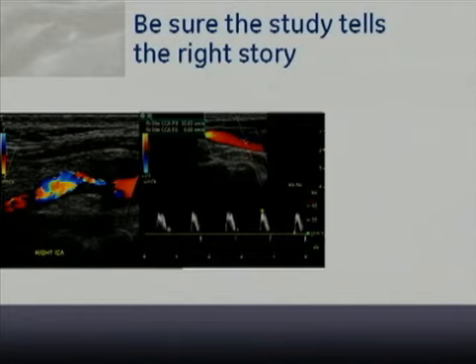Next, when she sampled in the common carotid artery, it looked like it was a very high resistance waveform and low velocity. And it looks like the angle correction is good, but she's sampling in the middle of the vessel, but not in the middle of the flow. So I really feel like the sample location is not correct. It should be in the middle of the flow.